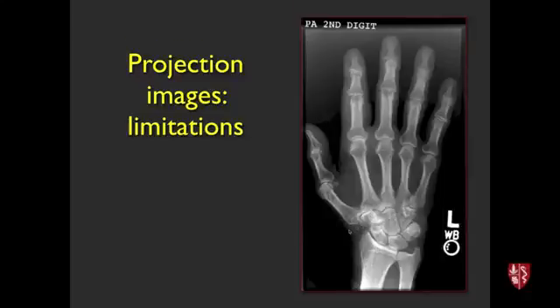It's a little bit like the rotated position, you mean? They're pretty good. Any of the fingers look like they might be more pudgy or swollen than the other? This says PA second digit. So somebody put on the image that the second digit, which is the index finger, looks a little bit thicker.